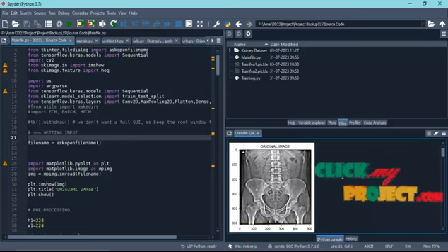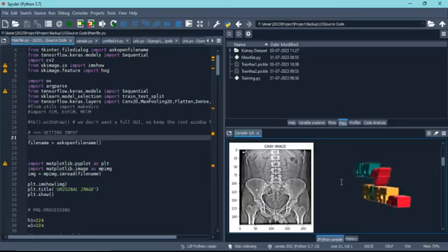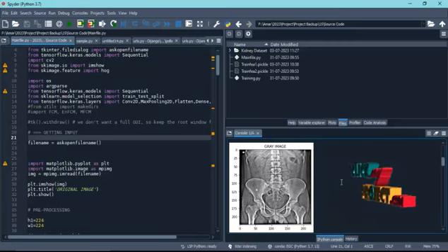After selecting the input image, we move to the second stage of the project, that is the pre-processing. Here the pre-processing size is 224 x 224. After doing the resize, the image is directly converted into grayscale form. In case the input image has the RGB channels, that is red, green, blue, the image will be automatically converted into grayscale form.